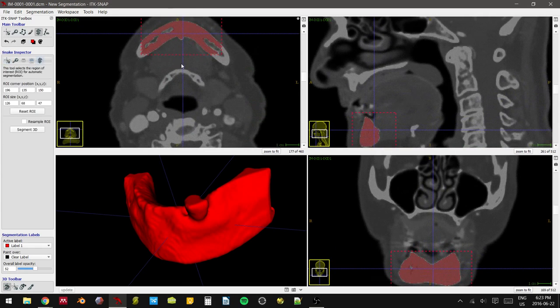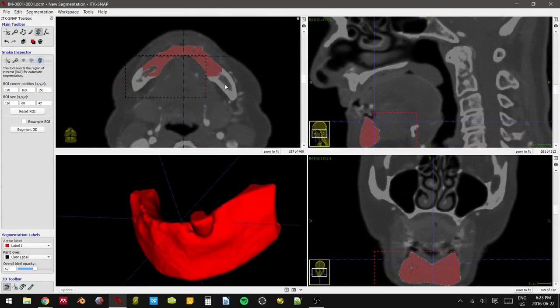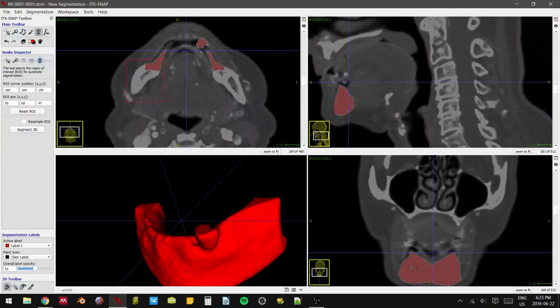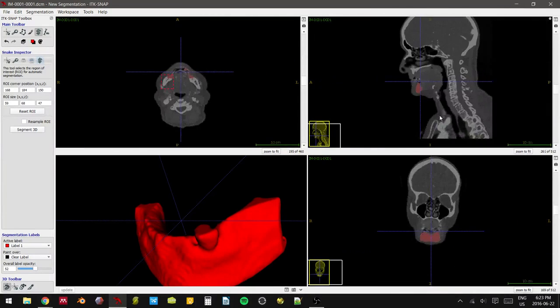And again, we're going to do this stepwise. So back to your segmentation active contour menu. You're going to move your region of interest out this way. We're going to go this way first. And as you can see here, the window disappears, like your region of interest for the active contour is gone here. There's no dotted lines or anything.